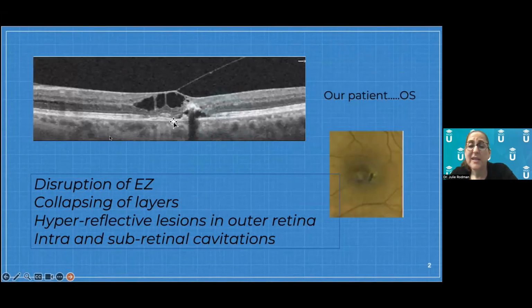The other eye, same thing. This patient also had vitreomacular traction in this eye as well. I'm sorry, I don't know why this keeps coming up. But you can see these intraretinal cystic spaces here with the ILM drape right over it, a very superficial line of ILM. This hyperreflectivity is the pigment plaquing. You can see the breakdown of the photoreceptors here, the loss of the photoreceptors all here. And this is the pigment migration.